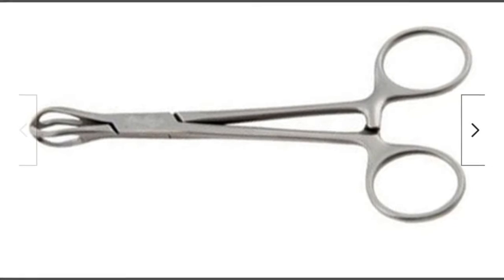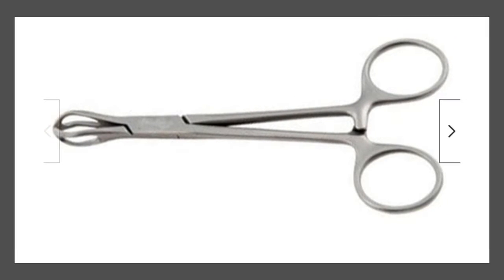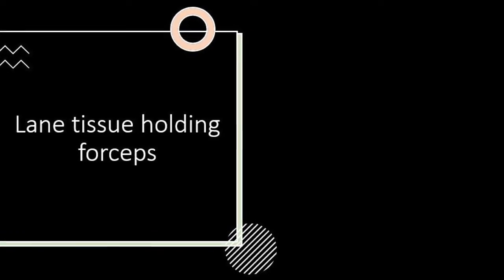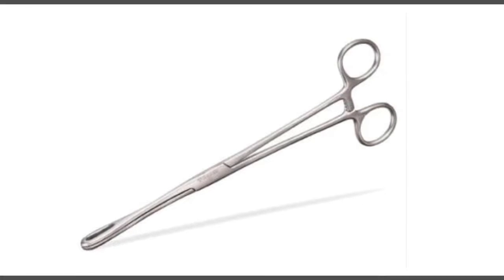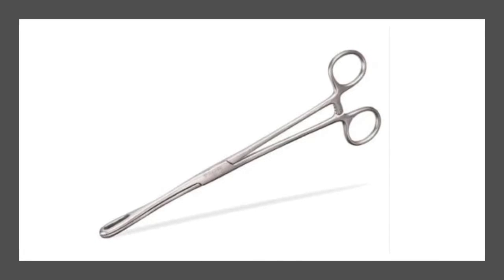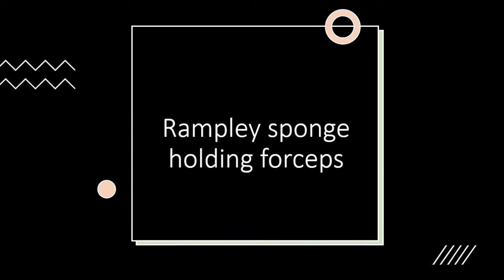This is our next instrument. What do you think this is called? This is a Lane tissue holding forceps. Right, moving on to our next instrument. I hope as obstetricians and gynecologists you have used this instrument at some point in your career. Right, this is a Rampley sponge holding forceps.